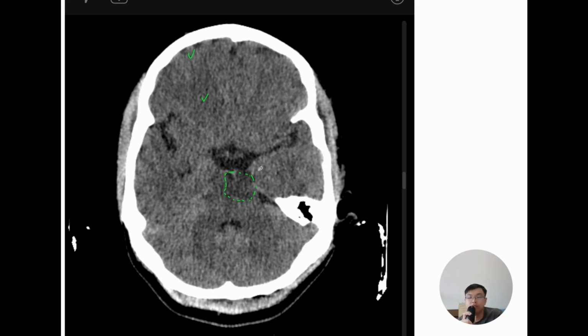Sometimes you may be confused, because of the presence of very dense petrous parts of the temporal bone, there may be some artifacts. But in this cut it cannot be accounted for by artifact, because usually artifacts should be streak-like, and at the same time only this portion is hypodense, and the petrous part of the temporal bone is not significantly present in this cut yet to account for the artifact.